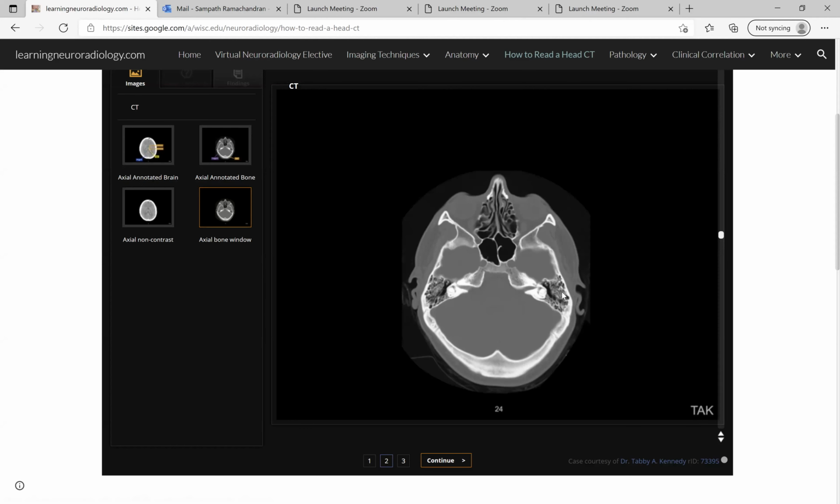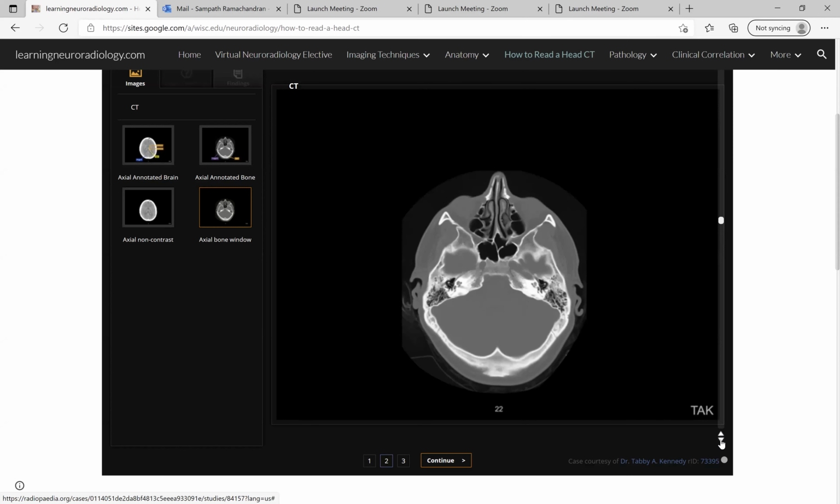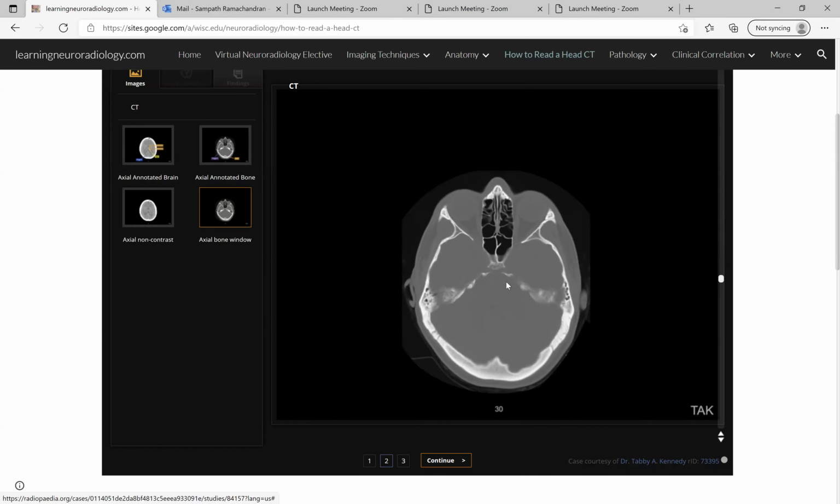And here we take a good look at the middle ear. You can see a portion of the stapes, the malleus and incus here, which is sometimes helpful to look for when you have issues with your hearing, and that's a different lecture altogether. So we can see a lot of things here in terms of basic information. Let me quickly switch over.